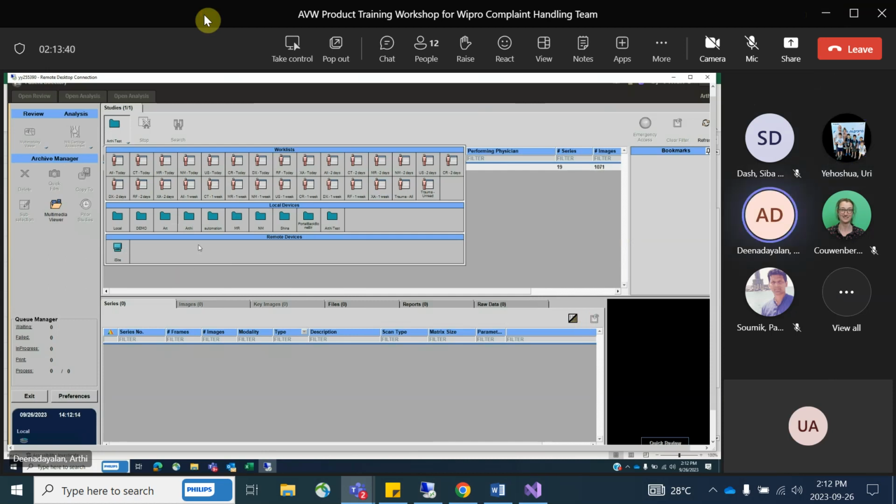I did not explain that, because when I created in the PMT, you saw that we had 7 checkboxes, right? Every user group has a few rights. I didn't want to go to that level, so that's why I did not explain that. When I checked it, I checked only a few. Wait, I'll probably show it.